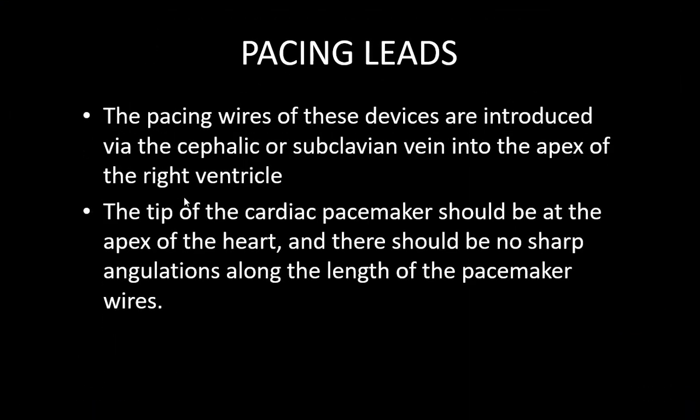Now, something about pacing leads. You know the pacing devices are introduced either via a cephalic vein or a subclavian vein, and the lead lies in the apex of the right ventricle. So the tip of the cardiac pacemaker should be at the apex, and there should be no sharp angulations along the length of the pacemaker wires.